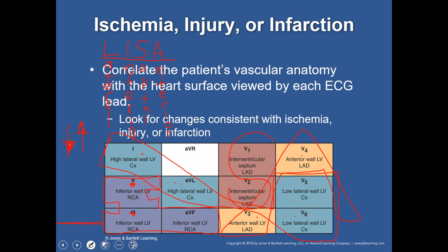Okay, so I don't know if this makes any sense to you, but we're going to talk our way through a few of these things, and we'll kind of mark it up, and I hope this makes sense. Once again, I'm just going to draw right through it, because I know you can't see me, you can just see the screen. So, once again, this is our L, this is our I, this is our S for septal, and this is our A for anterior. Big mess. Apologize about the mess. Hopefully it makes sense.